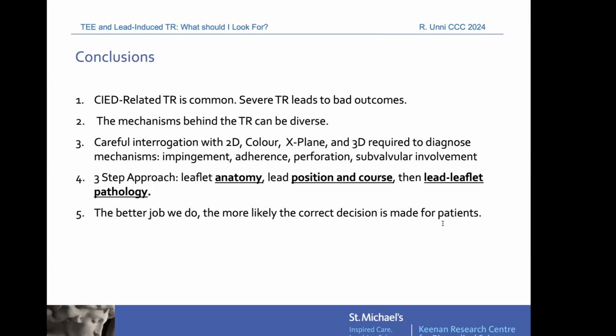That 3-step approach of getting the anatomy, getting the lead position on the course, and then identifying lead-leaflet pathology is helpful. The better job that we do in trying to identify these mechanisms, the more likely it will lead to the correct decision making being made for our patients.